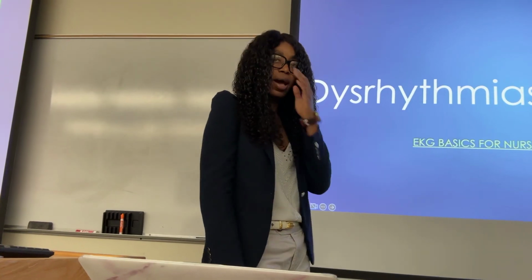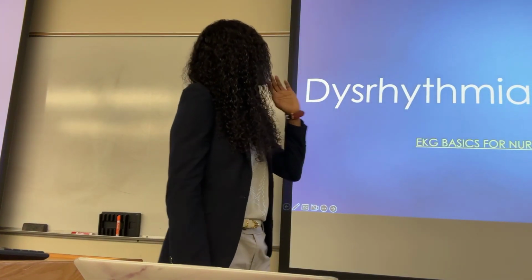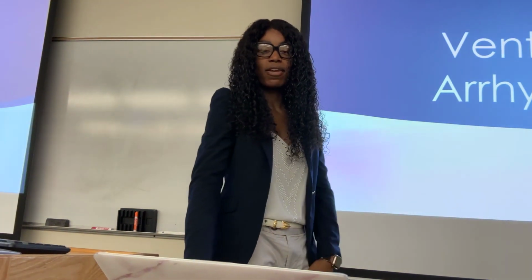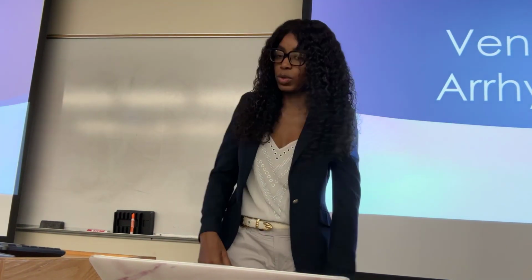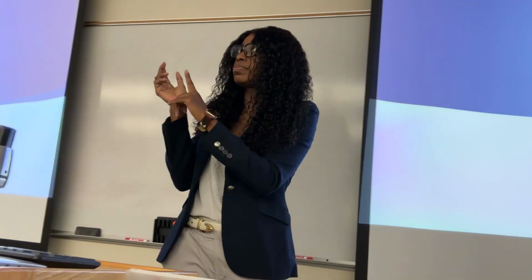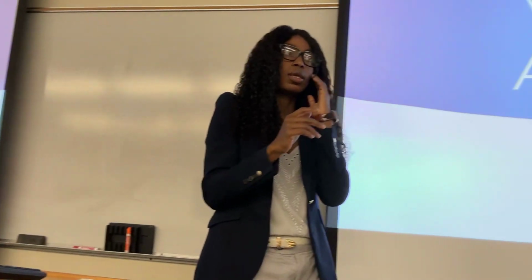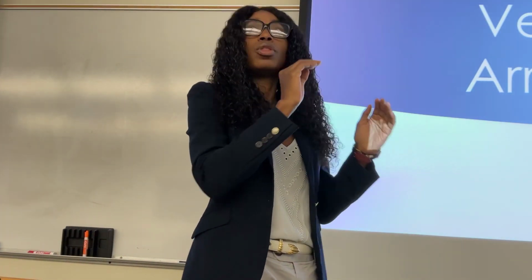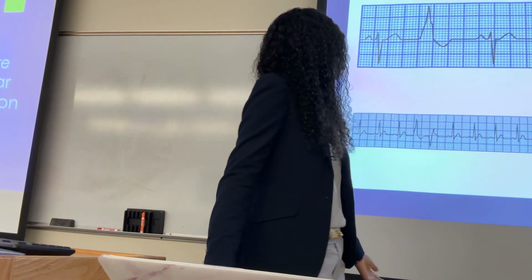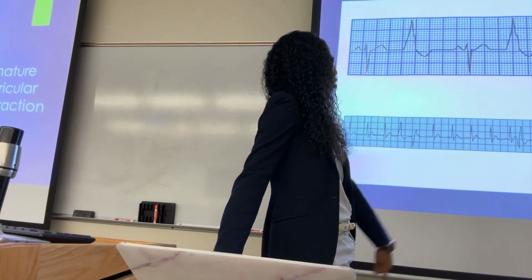Dysrhythmias, we're looking at now the ventricles, right? So when we look at ventricular arrhythmia, okay, we're thinking about which part of the PQRST? Ventricular arrhythmia, the QRS, yes. Okay, so the first one we're going to look at is premature ventricular contractions.